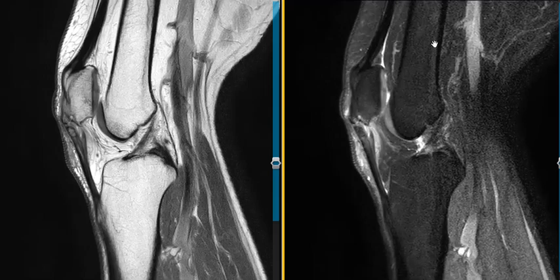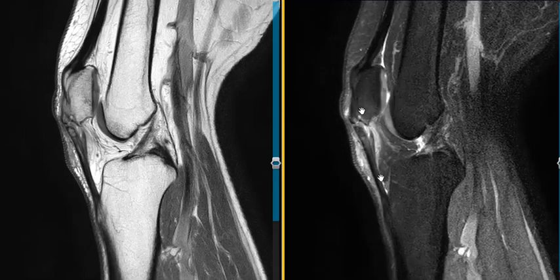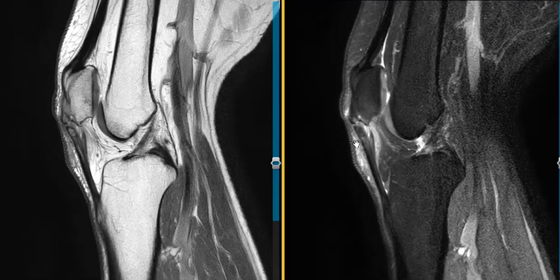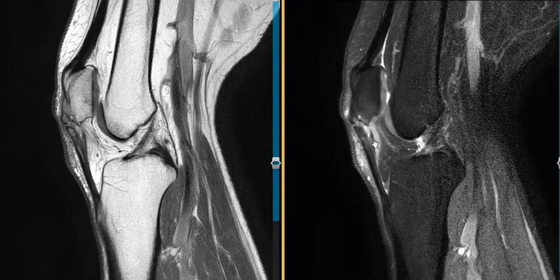And just for some anatomy, this is the femur, this is the tibia, this is the kneecap or patella. We have the quadriceps tendon up here looking completely normal, nice and uniform and low in signal. And we see the patellar tendon along the side looking pretty good, but centrally it is thick, irritated, has bright signal, so some micro tearing centrally. And we see this thick rind of inflammation or granulation tissue or edema all around that. So we know this is acute upon chronic inflammation.